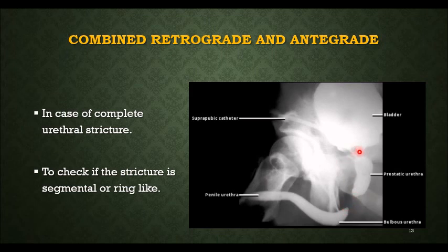If the contrast medium continues downwards and reaches this point, you will conclude that there is a complete ring-like stricture.